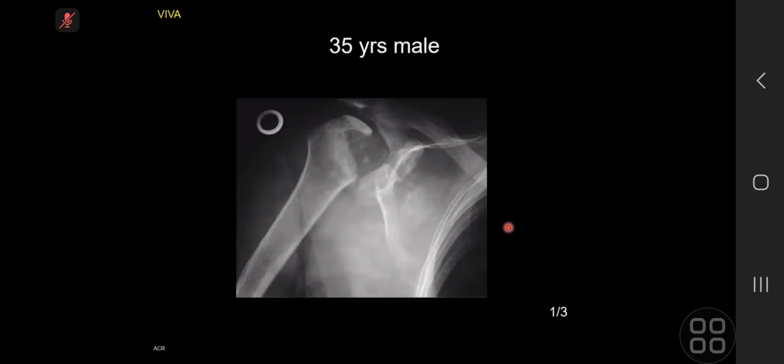There is bone destruction, increased sclerosis, and debris within the right glenohumeral joint. There's also expansion of the joint space. Findings are in keeping with a Charcot joint of the right shoulder. My next step would be to image the spine to exclude a syrinx.